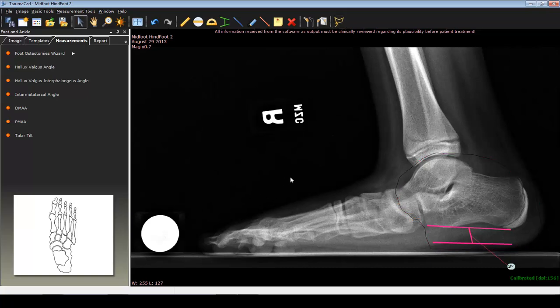and then place it and close it off. Now, as you scroll over your fragment, you see that the center of that, the bullseye red dot that shows up, is the rotation point. Because we selected around 2 joints that are used in this correction, we kind of serendipitously end up at the lateral process of the talus. And you can see here's this red dot, and it's right at the lateral process of the talus. And that is commonly known as the hinge point of the ankle and the rotation point of the ankle. So in our example, this has worked out nicely. We're going to rotate around the lateral process of the talus and achieve our correction.